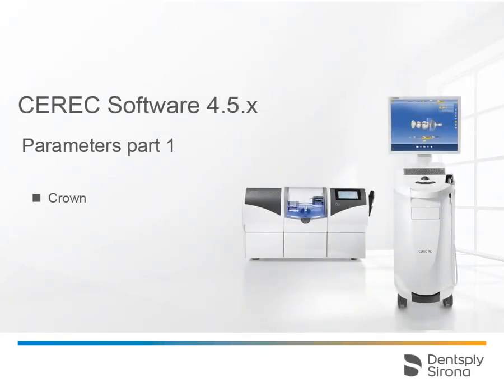Welcome to this video tutorial on the topic of parameters, Part 1. This video will show you how to adjust the global parameters for a crown in the System menu. Further tutorials on the topic of parameters are available in our tutorial library.